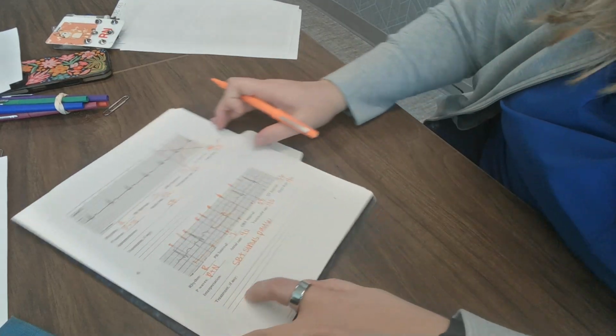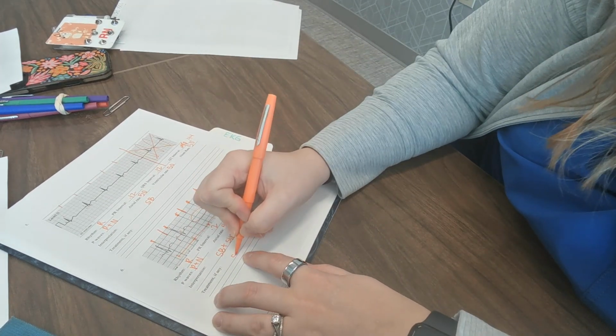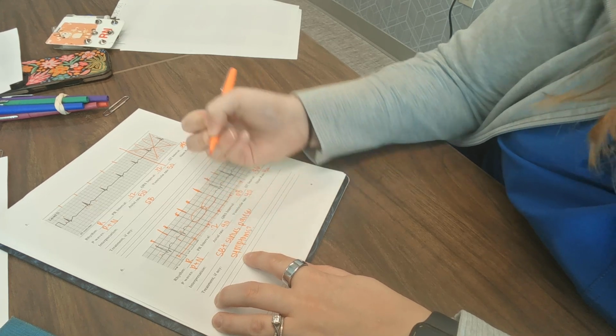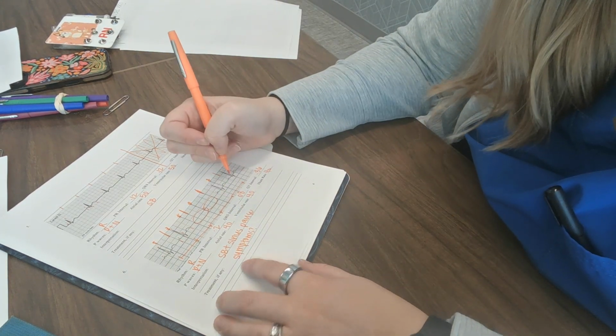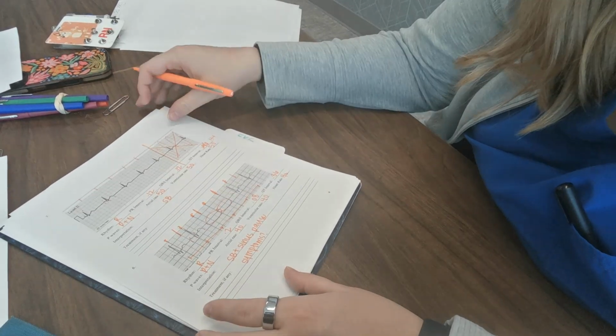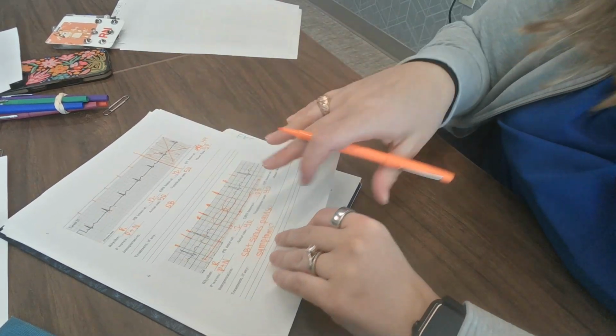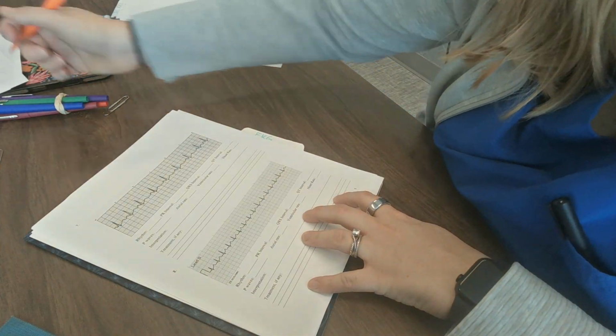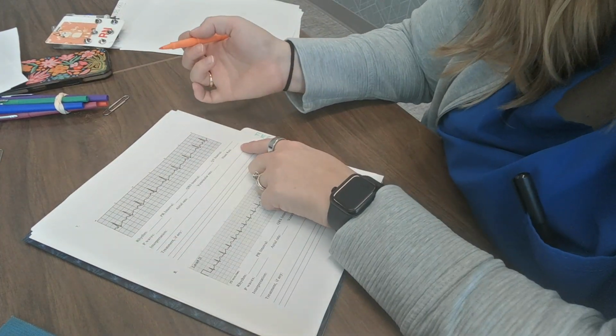Okay, my lines are not perfectly drawn because I didn't use a ruler or anything, but an approximation is good enough. Okay, so here what we're going to look at is the patient symptomatic? Atropine may work on this for the underlying sinus bradycardia. It may not. So we're going to look at their signs and symptoms, and we're going to go from there. Usually it's kind of benign.